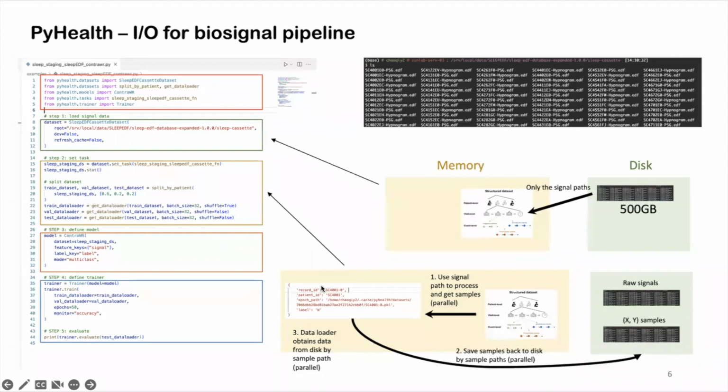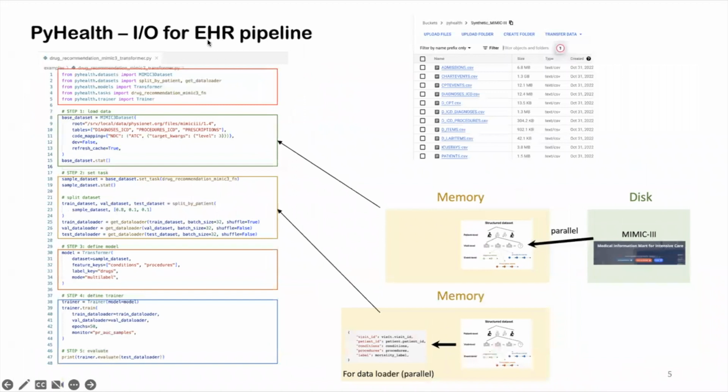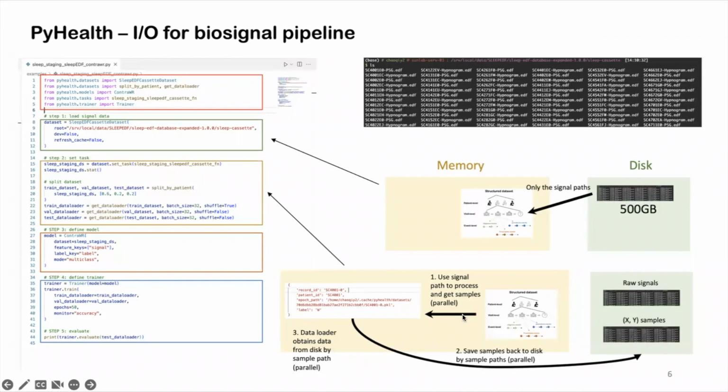So I will maybe go back to the EEG pipeline. Can I ask you a question? Sure, go ahead. In the epochs, can you tie them at the end back to the patient? So you load, and split this entire EEG signal up, then you process them and store them back in the cache. But do you introduce an index so that you know from which patient?